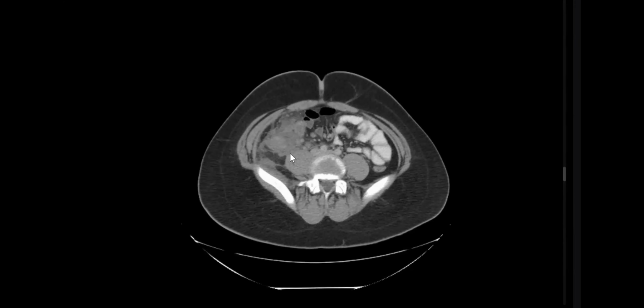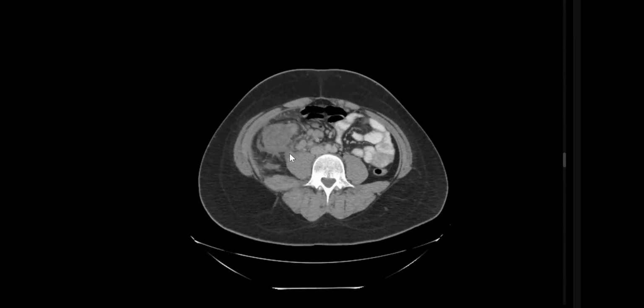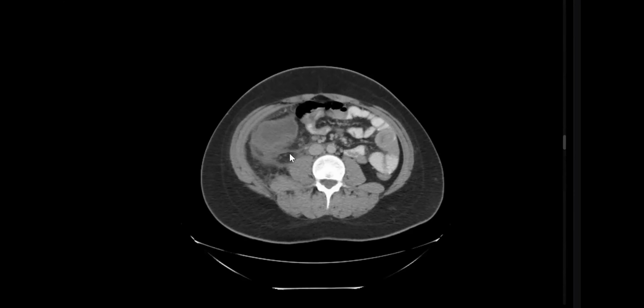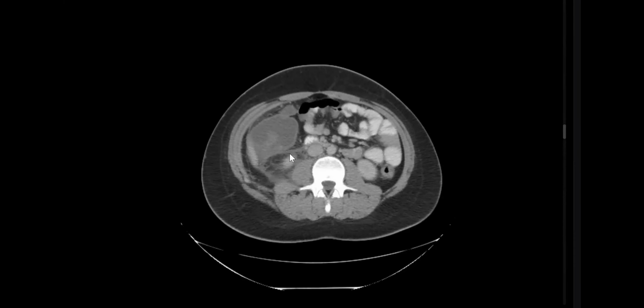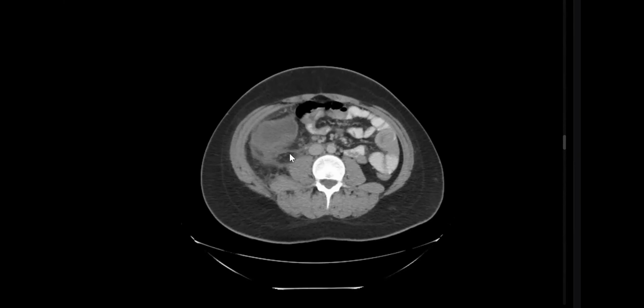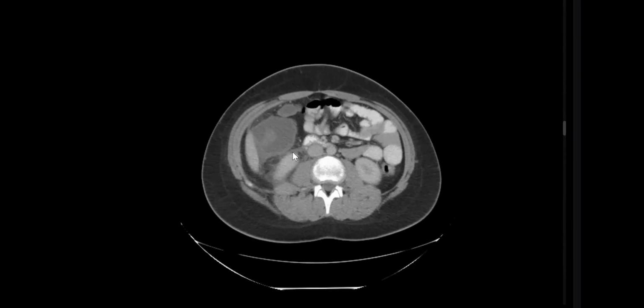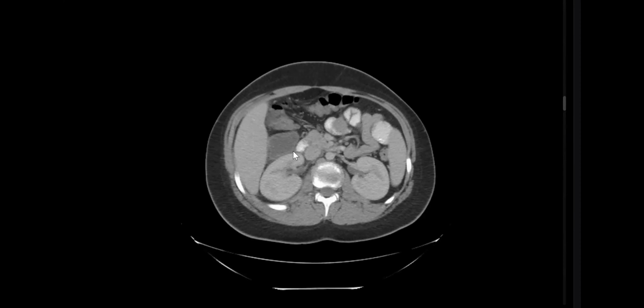Very good. Any inflammatory or infectious condition, like diverticular disease, can lead to thrombosis, with drainage into the mesenteric and portal veins and into the liver. So I have to rule out the presence of thrombosis. I would also like to see the liver to look for any hepatic abscess, which I cannot find. Very good.